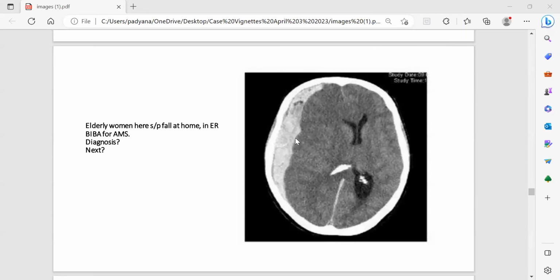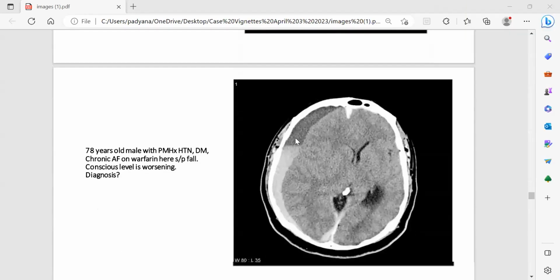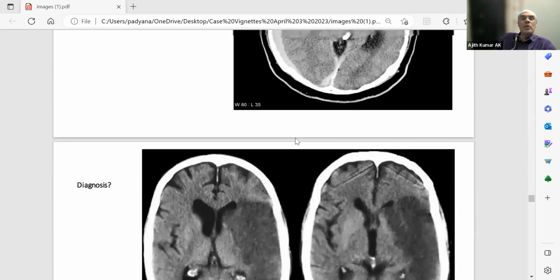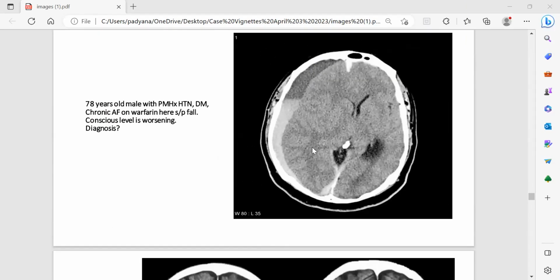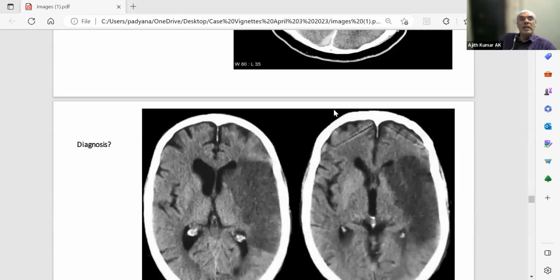You have to mention acute SDH. That is also important. Acute, very good. Right-sided acute and chronic SDH. Excellent. I may say that this will be a subacute also. The color is not purely black, maybe subjective. Anyway, it's acute, there is no doubt. Acute or subacute, I don't know, maybe. The color is not really dark.